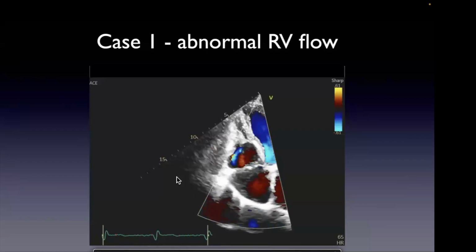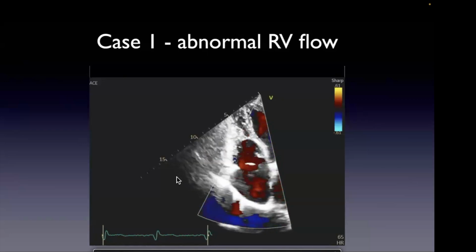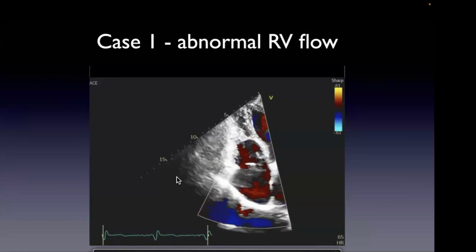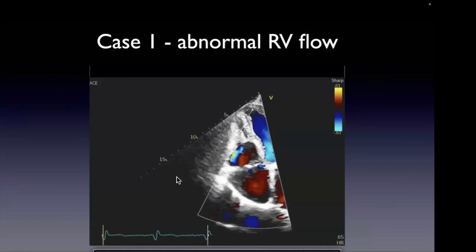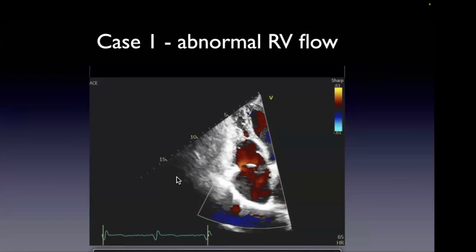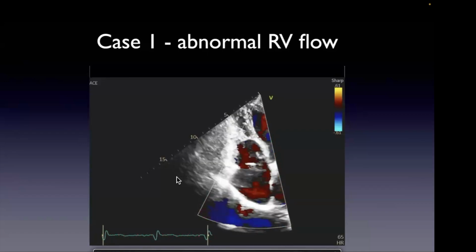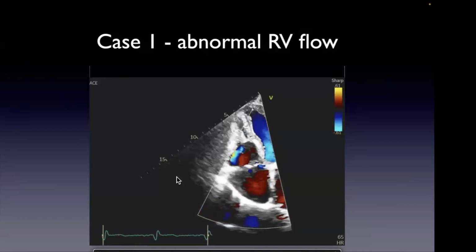What are vascular structures around the heart? Give me some vascular structures around the heart. PA. Okay. Coronary sinus. Well, the coronary sinus is at the base. Okay, so what feeds blood into the heart? What supplies blood to the heart to allow it to pump? What do we call those? Coronary arteries. Oh my gosh, you know this, right? We see coronary fistula into all the chambers. So could this be a coronary fistula into the right ventricle?